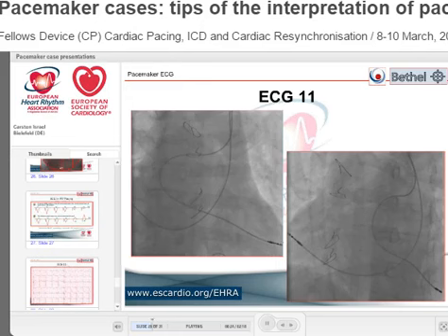So now you see here, the leads are very, very far apart from each other. With the atrial lead, usually in left-sided SVCs, you only get to the lateral right atrium. But this doesn't look too bad. We go from the coronary sinus to the right atrium, and then here to the right ventricle, right? It doesn't look so bad. So like Haran said, always when you implant, take 5 seconds, go to LAO view. This is PA, and this is LAO view.